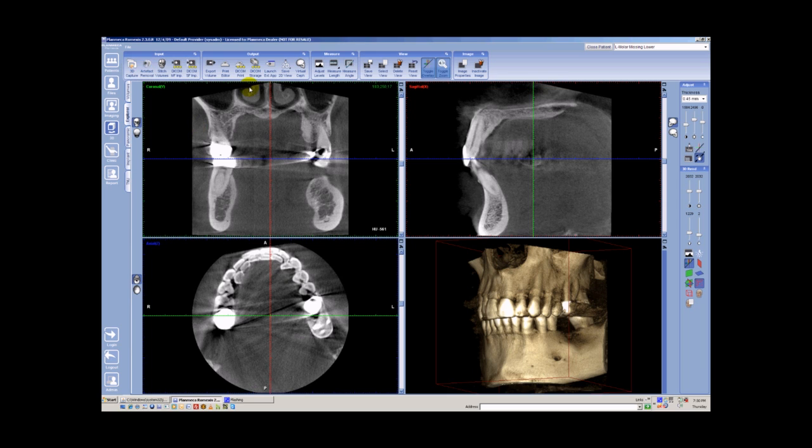The top is all of your input-output controls, basically. We have input for capturing, for doing artifact removal, exporting for output, and printing functions. We also have measuring tools for measuring lengths and measuring angles. We can save different customized views that we have selected, and so forth, and image properties and such. That's across the top. Over on the right-hand side are all of our controls, such as gamma adjustments, brightness controls, and even sharpness control for the view.